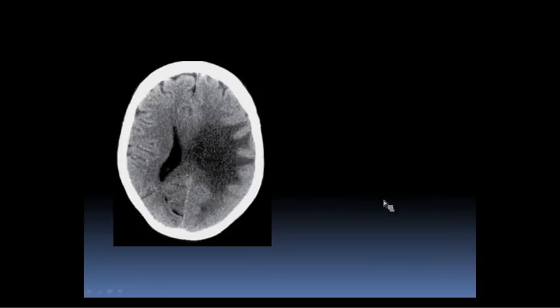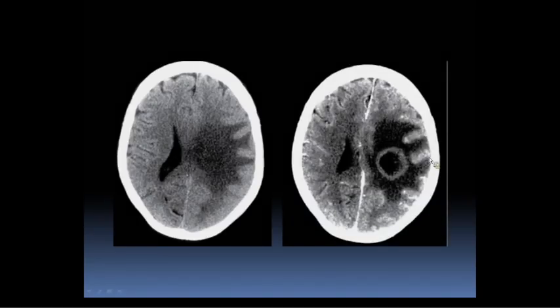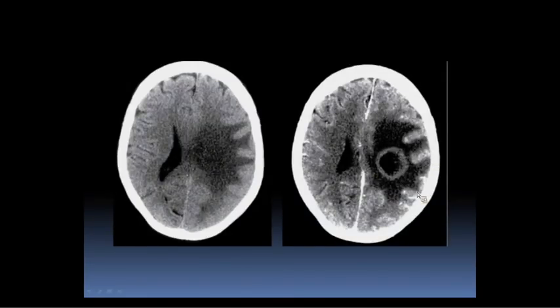And so here's another example of typical vasogenic edema. So with vasogenic edema, also it's described as having these finger-like processes, which is essentially just the subcortical white matter, which is edematous, and you see them in relief against the overlying cortex. So if you give contrast in this case, you see that there was an underlying mass here, which you couldn't see without contrast, but you know that this is a vasogenic edema pattern. This is not a stroke pattern.